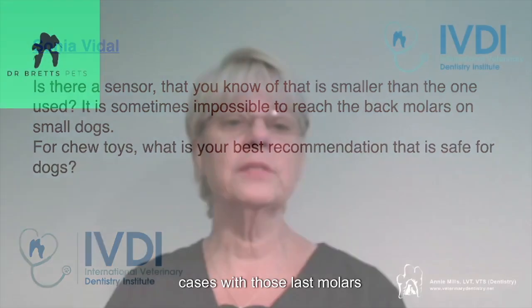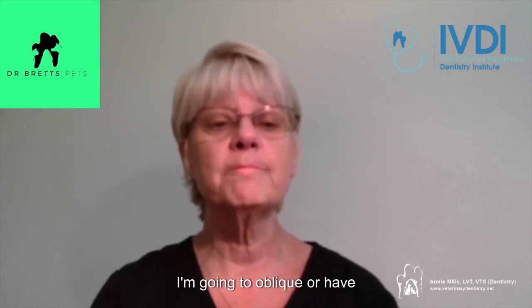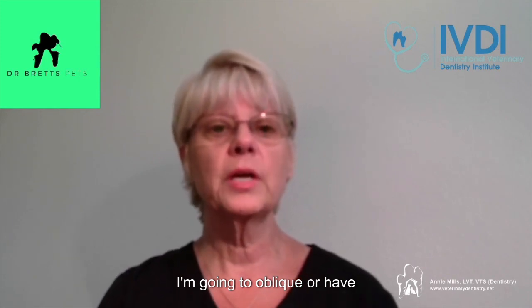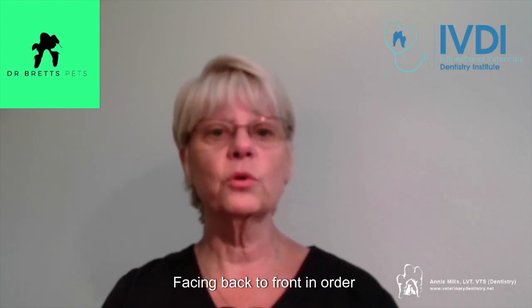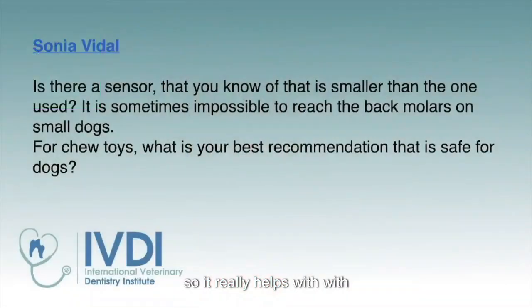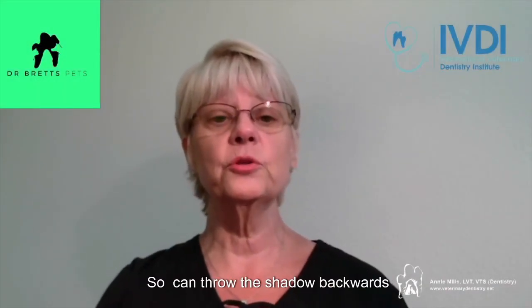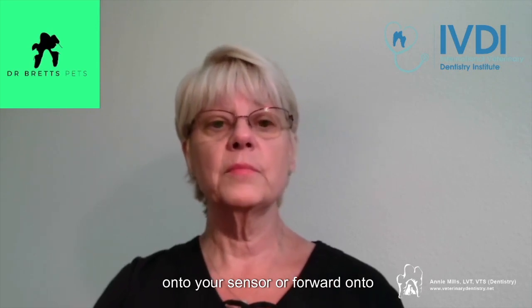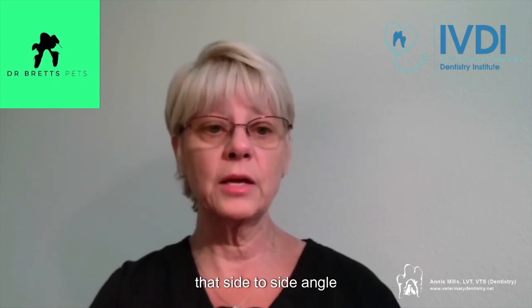And so in a lot of cases with those last molars, I'm going to oblique or have my tube head kind of facing back to front in order to throw that shadow forward. And so it really helps with having that tube head and knowing where your shadow is thrown based on where your sun is in relation to your sensor. So you can throw the shadow backwards onto your sensor or forward onto your sensor just by changing that side to side angle.